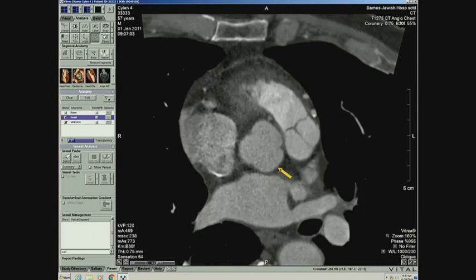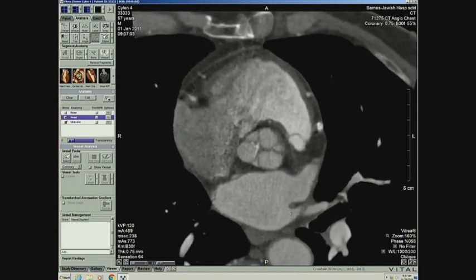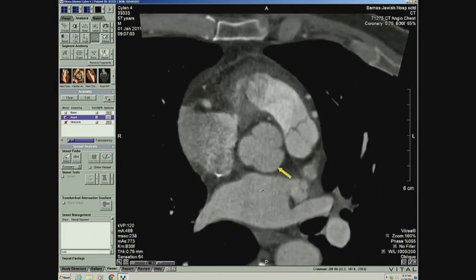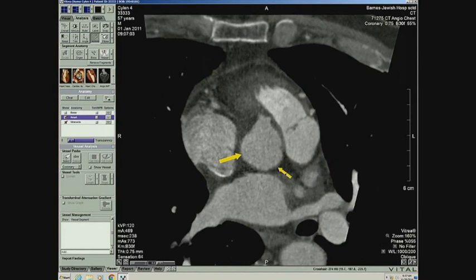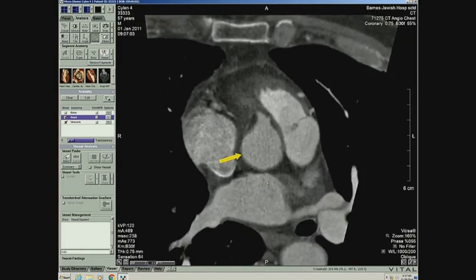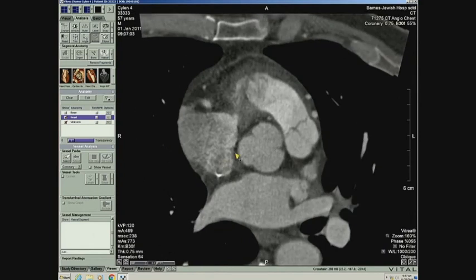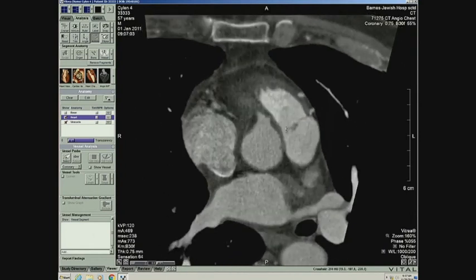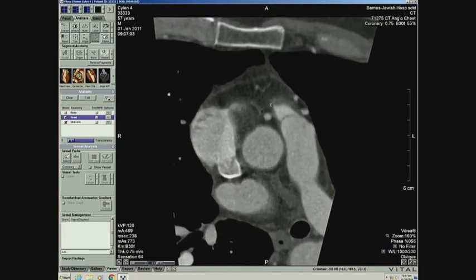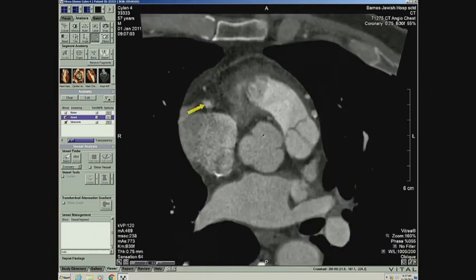And we'll start with the left like we always did before, the yellow arrow going towards it. We see nothing coming off. I want to see if there's anything coming off the non-coronary sinus, this second arrow here. Nothing coming off there, so that's fine. Now we'll look at the right sinus, get rid of that arrow, here. And coming off of it, we see these 2 vessels with a common origin. Now the ostium is nice and open, and this one, dilated, goes off towards this direction here.